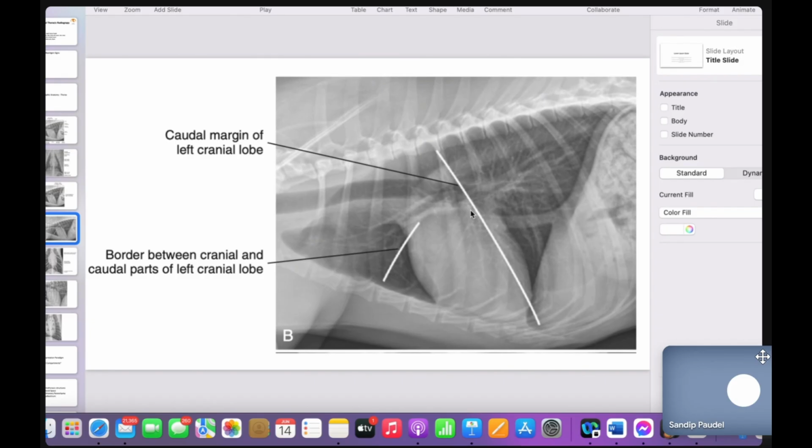There is one, and another one is down there, and in between that there is a bronchus. So artery supply, bronchus, and venous supply. So this is how it has a supply.